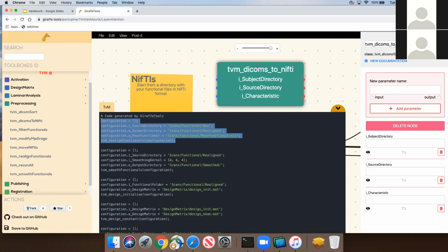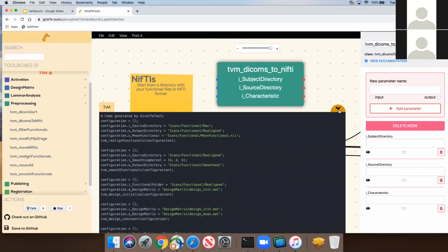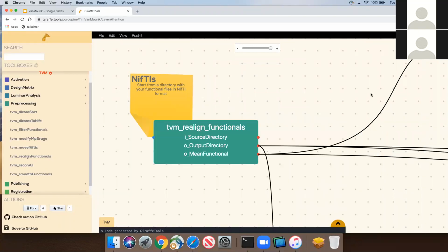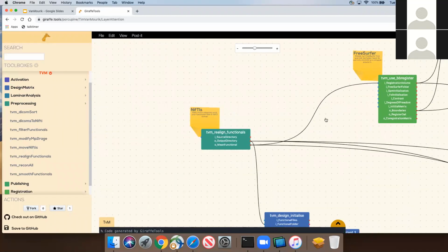How did you open the window? How did I open this window? Yes, right. Okay. So here in the browser, there is just this little box, and let me quickly take that one and delete it again. Anyway, the point is also not so much that you can do a realignment. The point is that this is the entire analysis.